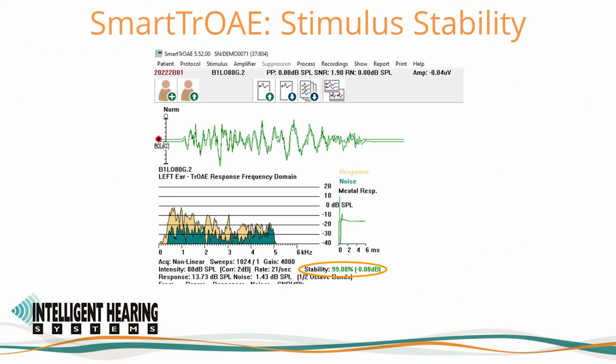We have also added a stimulus stability measure. The stimulus stability quality measure is done in conjunction with the initial and final probe check measure.